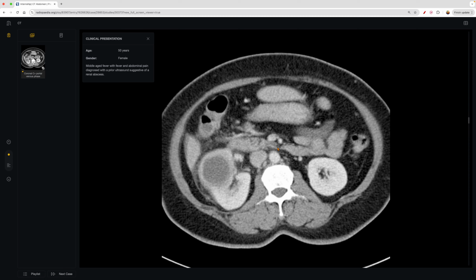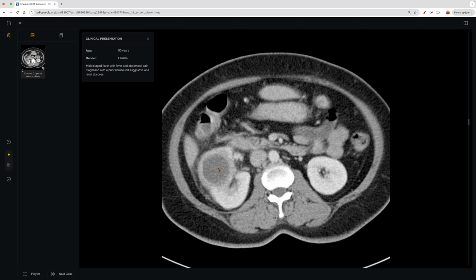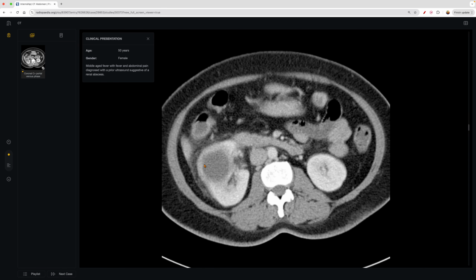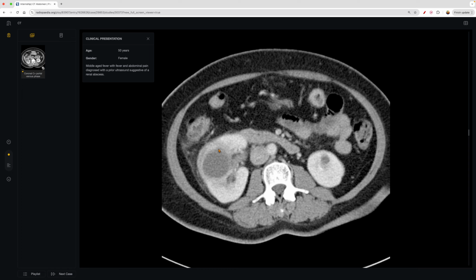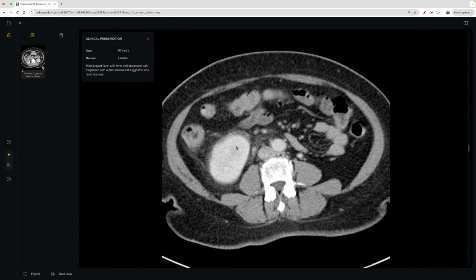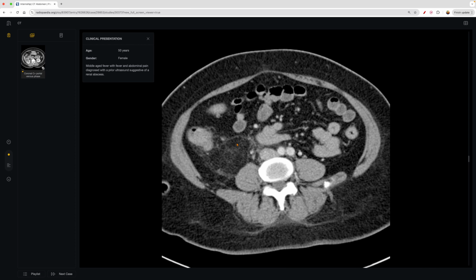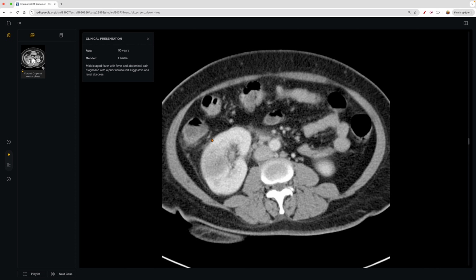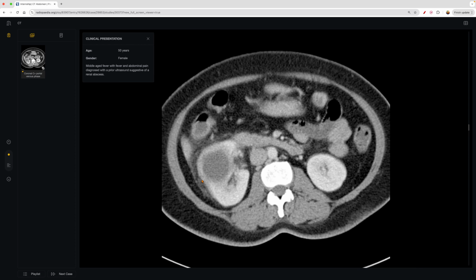So for a renal abscess, let's think about what you might expect. Certainly you'd be expecting inflammation, right? You can see here, the abscess has a well circumscribed wall around it as well. It's within the parenchyma here. And as you keep going, you can see that fat stranding again. It's a super important clue for CT imaging.